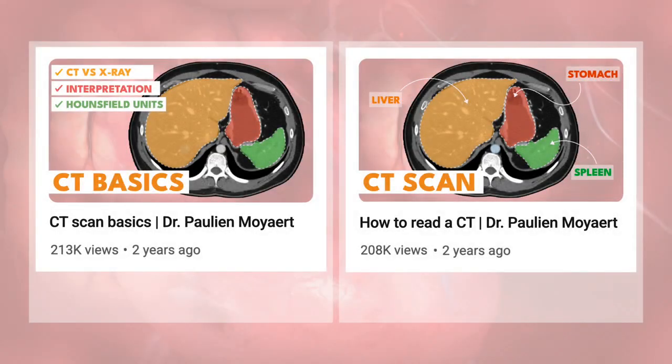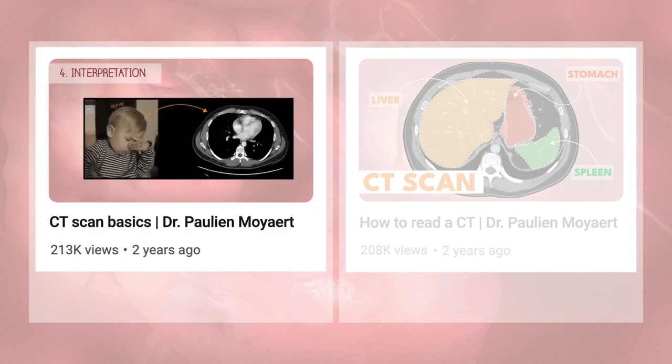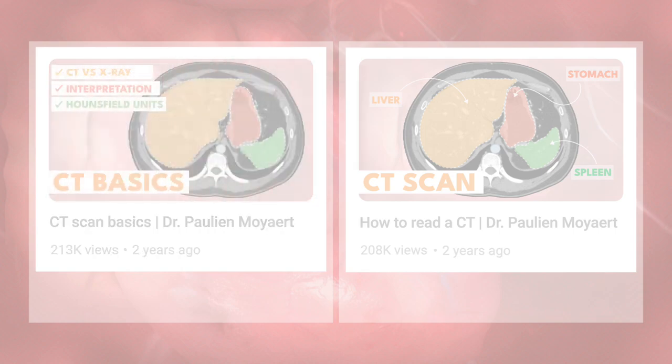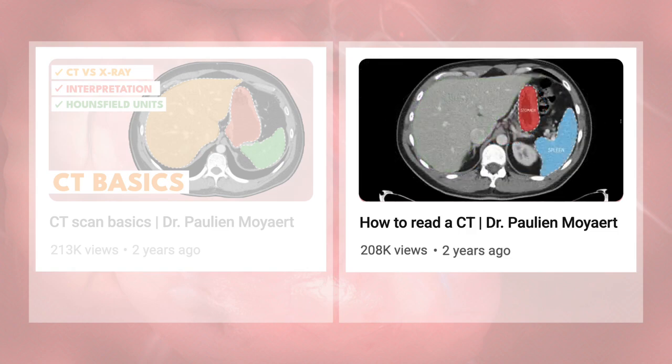This video is part of a two-part series on how to read a CT scan. In the first video, I explained the basic concepts of CT. In this video, I'll guide you step by step through reading an actual scan.